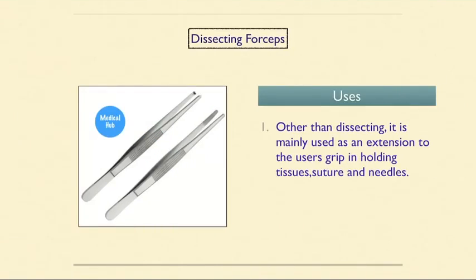Next, this is dissecting forceps. Other than dissecting, it is mainly used as an extension to the user's grip in holding tissue, suture and needles.